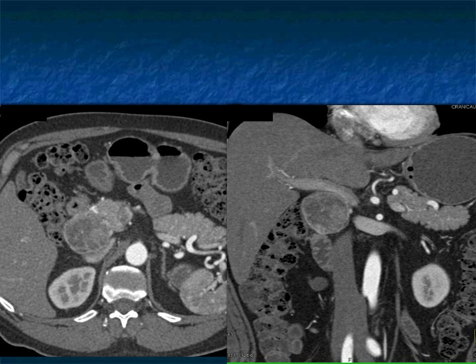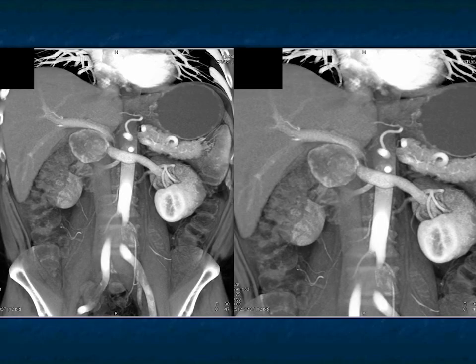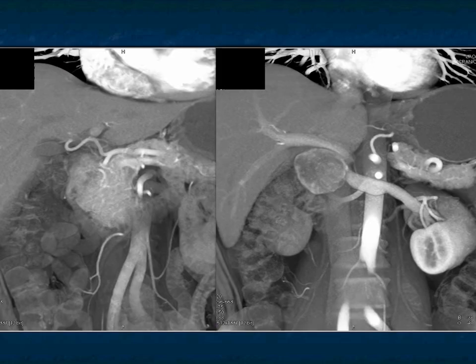Here are just really nice margins. Carcinoid, being a neuroendocrine tumor, is often vascular. Here it is very nicely shown. And of course, in this case, the patient was referred to us as a neuroendocrine tumor of the pancreas, and you can imagine why that indeed is the case and why that's a good possibility. But this was a carcinoid tumor.